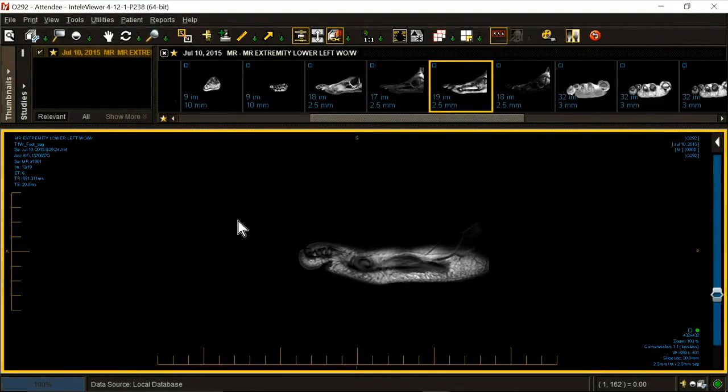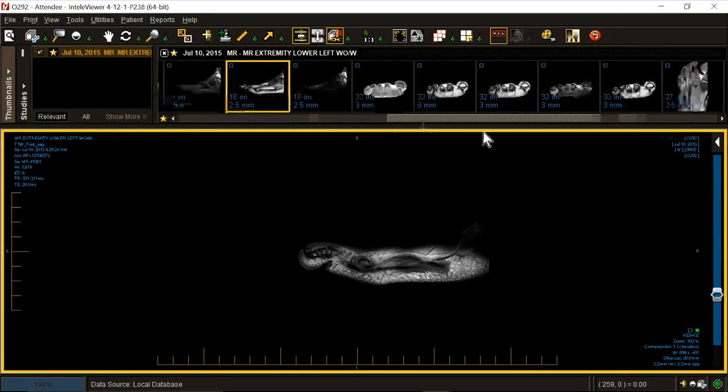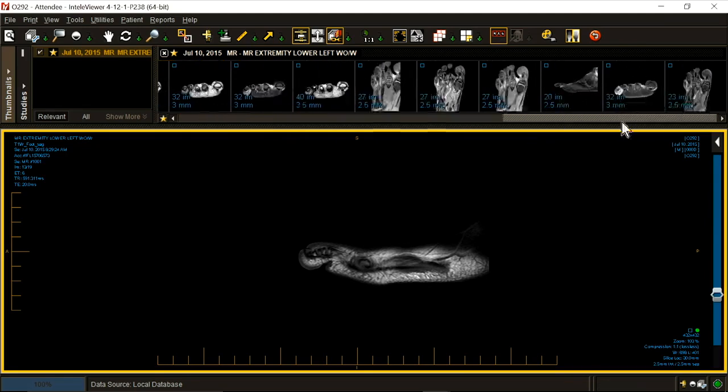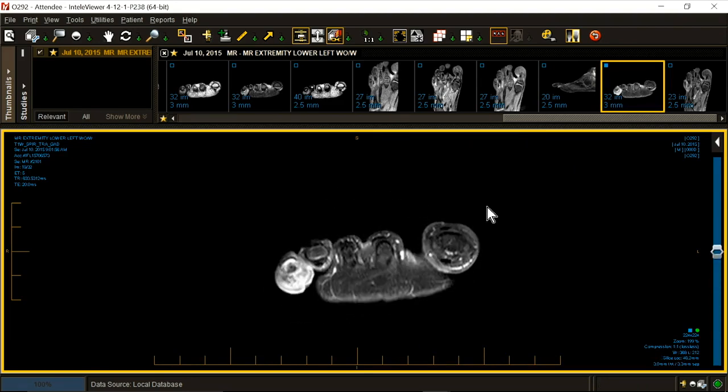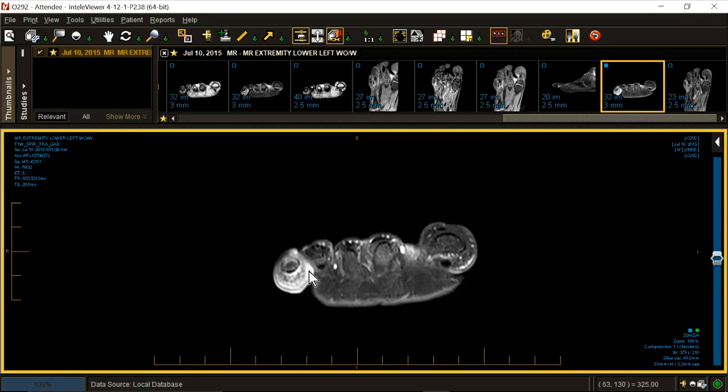Evaluate for osteomyelitis of the fifth toe plantar. Patient had a cellulitis. Before the age of antibiotics, a cellulitis could be fatal. Calvin Coolidge, one of our earlier presidents, his son was playing lawn tennis. He got a cellulitis from sliding on the lawn. He died 2 weeks later from streptococcal septicemia. Today we don't have that problem to face. But we do have a cellulitis in this case.